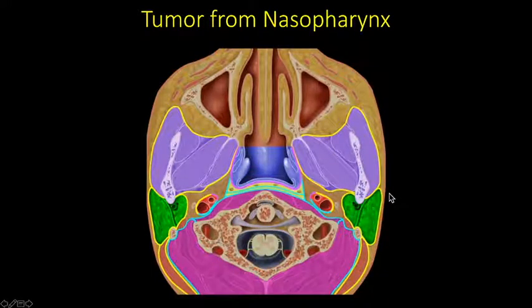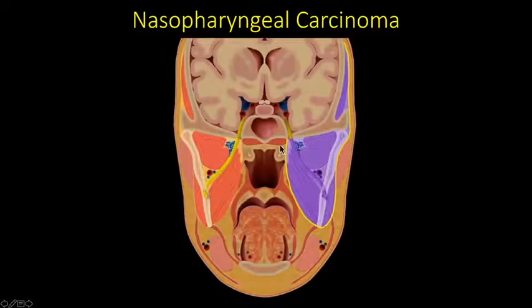Tumor can also come from the nasopharynx, just like I showed you with infection earlier, coming from the oropharynx and going laterally across those narrow anterior fat planes of the parapharyngeal space to get into the muscles of mastication. And on its way there, as it crosses these narrow fat planes of the parapharyngeal space, it could cross the path of V3, the mandibular nerve.